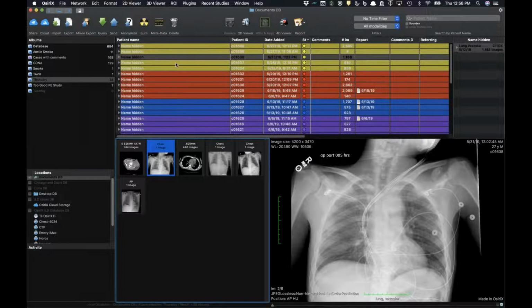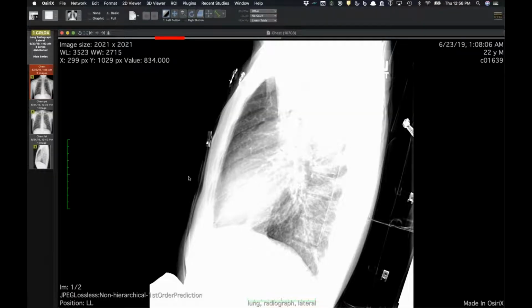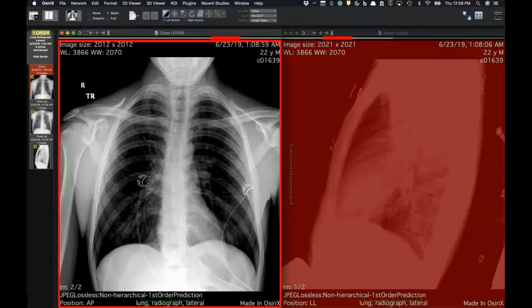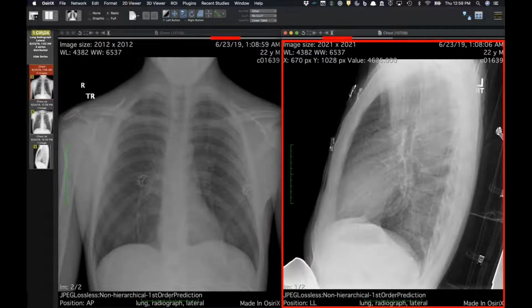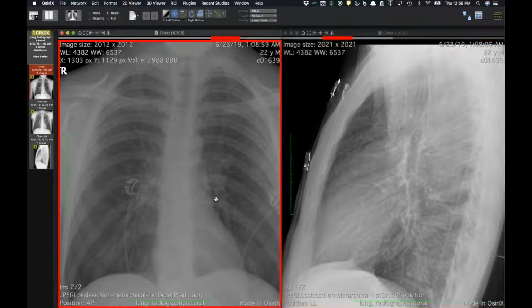And then this one I'll finish with. This is just a quick radiograph. And again, this was from Kim, who was on call this weekend and texted me this photo. This is a patient who came in, and the PA radiograph, I would argue, looks normal, but I'll give you a second, see what you see on the lateral.